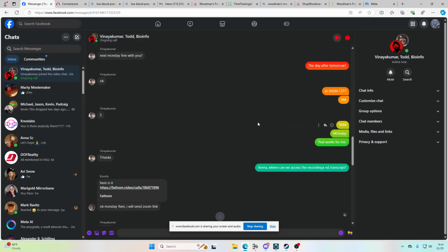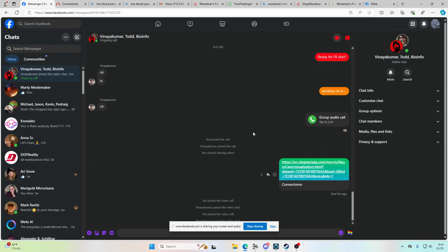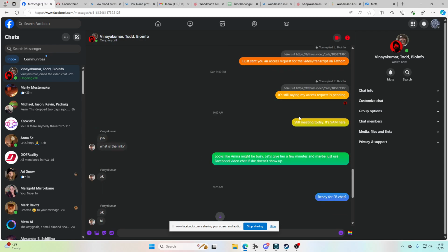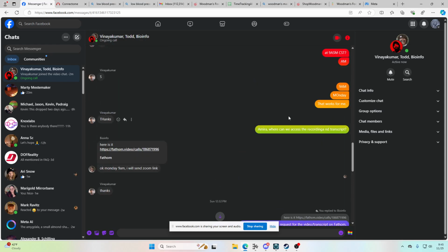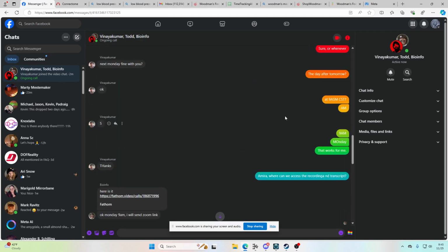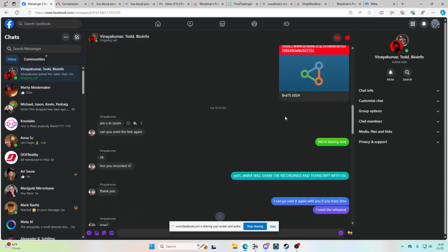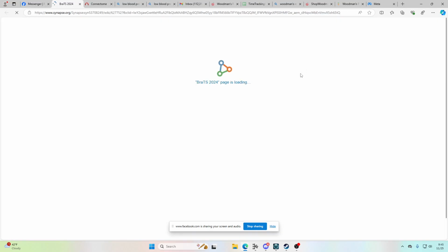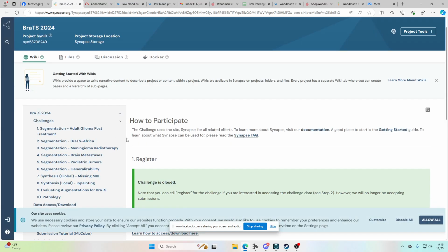Okay. So, I think I sent Amira, well, yesterday during our discussion, I posted right here a link to the competition that I got this from. It's a competition to analyze MRI data and segment out the tumors from the healthy cells.